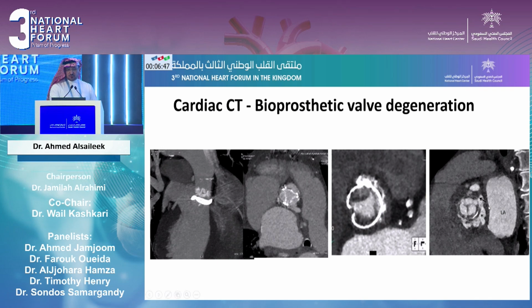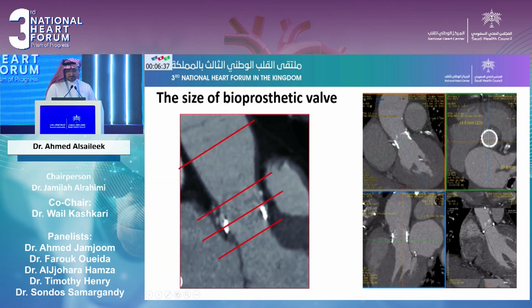And also we need to check if there is anything around the valve, because this is important: this patient might not go for valve-in-valve TAVI, rather he should go for another surgery.